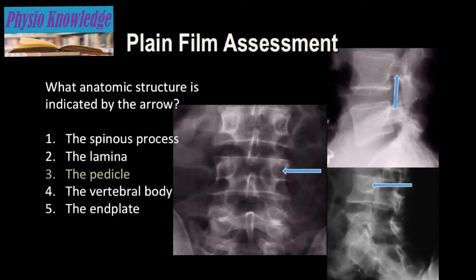So based on what we talked about, this structure is going to be the pedicle, and it's initially easier to identify here that we're dealing with the pedicle. Another way of seeing it, you should also look for the face here, two eyes, and the spinous process represents the nose.